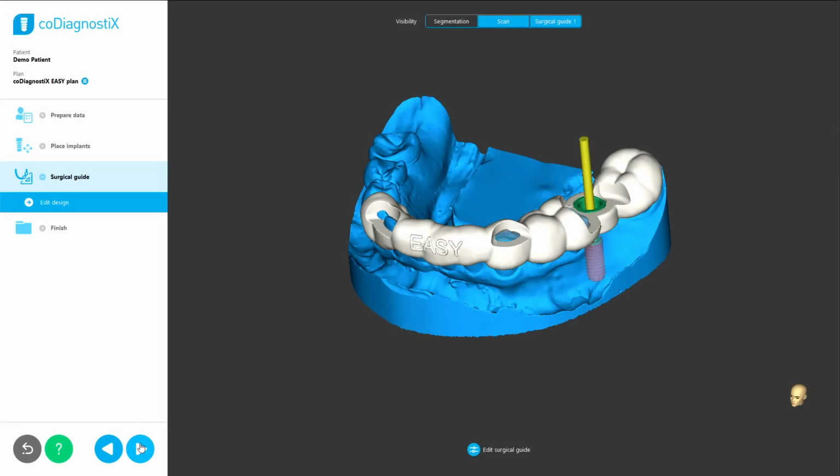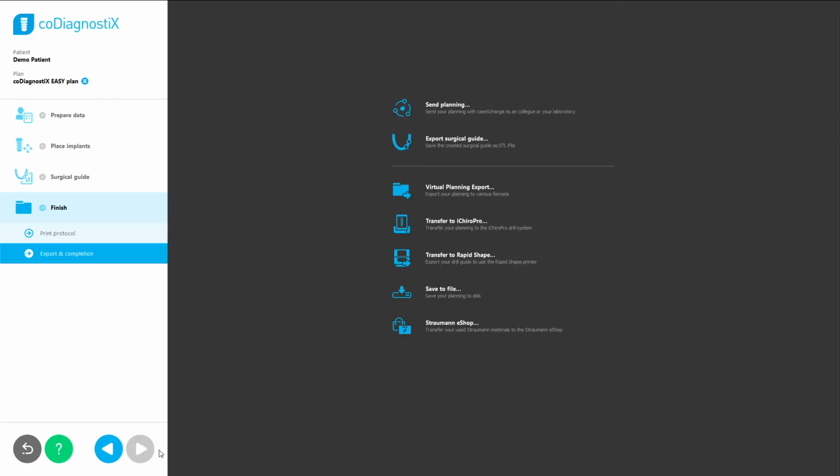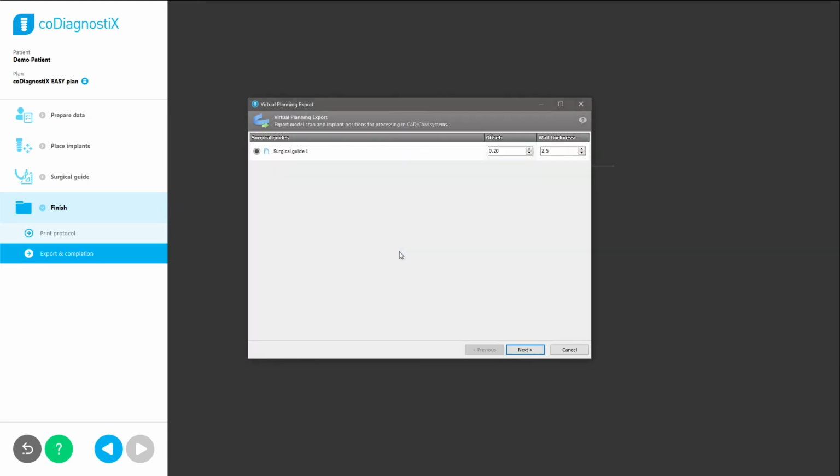Finally, the last page gives a visually concise overview of actions for possible next steps, such as sending the finished guide to a printer, instead of hiding these functions in a menu.